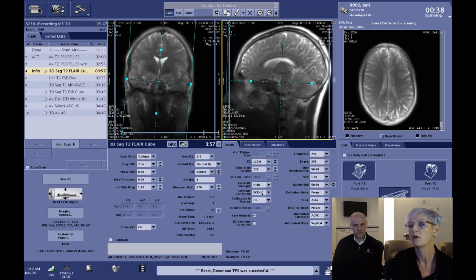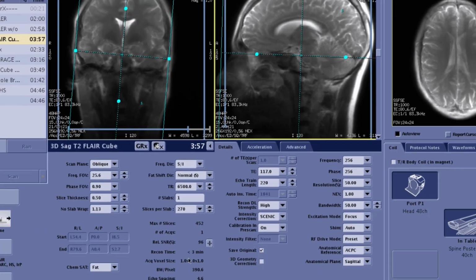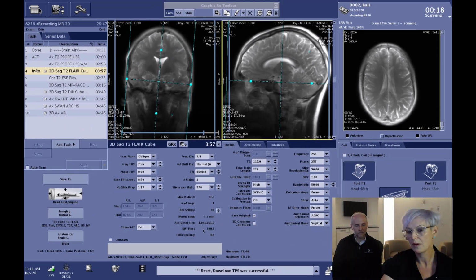On top of it, we do a spectral fat saturation, where we, before Recon DL, would maybe have a little bit more conservative pixel size, around 1.3 by 1.3 slice thickness, in order to keep the scan time reasonable for your patient. But here, applying Recon DL, I'm going to have an isotropic voxel 1 by 1 by 1, and I'm staying with my scan time under 4 minutes.